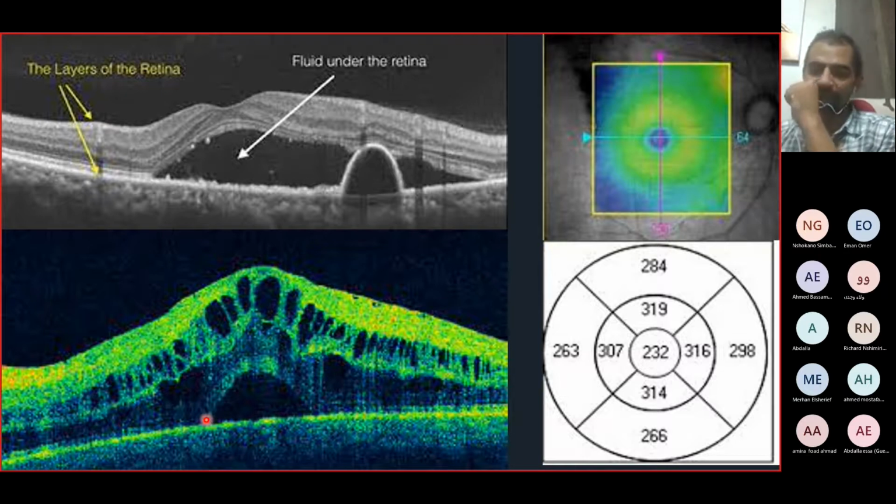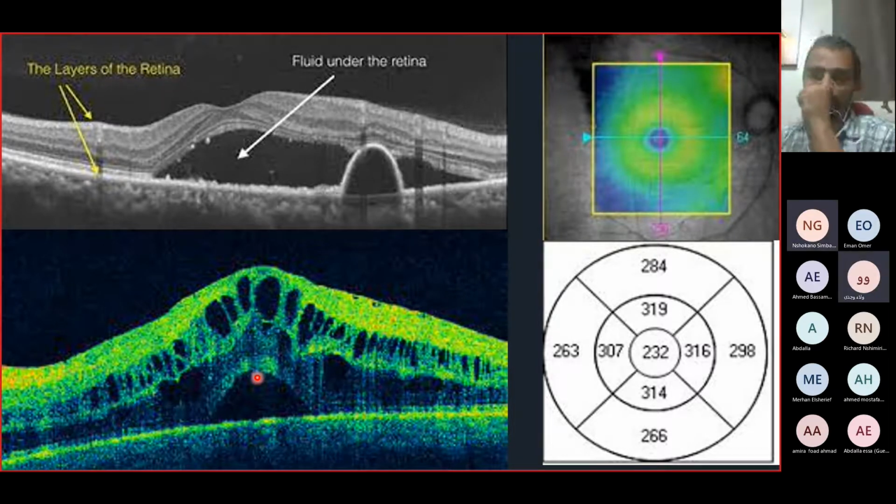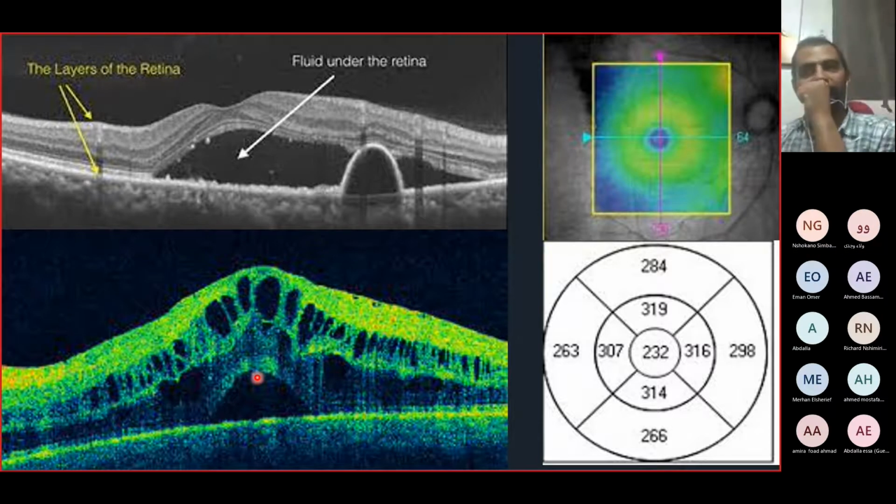In addition to that, which type of detachment is this? Neurosensory detachment. So there is cystoid macular edema, intraretinal fluid, and neurosensory detachment, subretinal fluid. What diseases can cause this? Give me some examples. Diabetic retinopathy. Okay. What else? Vein occlusion. Vascular occlusions. And what else, Dr. Gloria? I didn't hear you. Irvine-Gass syndrome, or a post-operative cystoid macular edema.